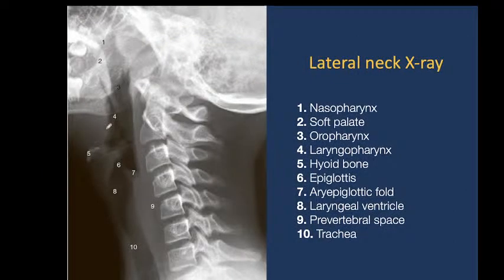Next part is the neck, and we see neck organs. Mostly we see the larynx here, and communication with pharynx. And then we see number 10 is the trachea, which is used for transporting air to the lungs.